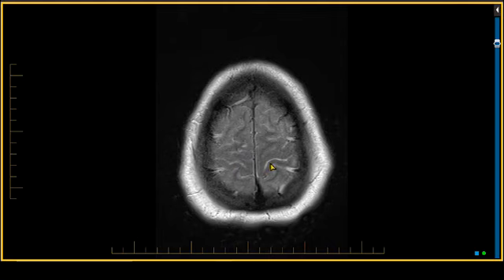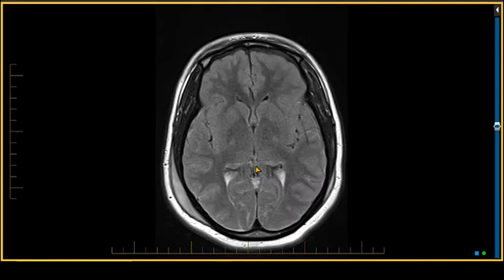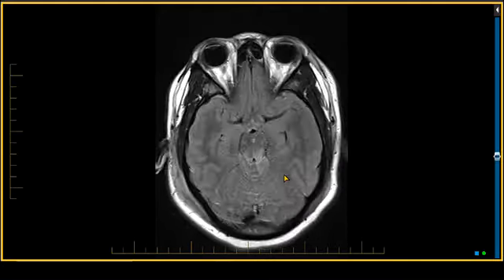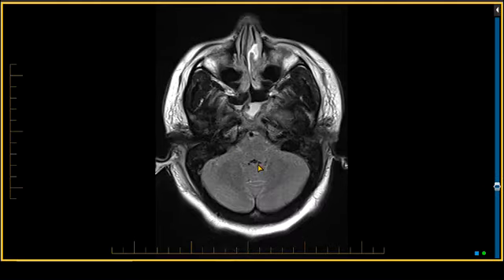Now, this may be any pathology in the subarachnoid space, so it can be meningitis in a different situation. So there's subarachnoid hemorrhage, and we see that indeed there is injury to the splenium of the corpus callosum, and there is blood that is seen within the occipital horns of the lateral ventricles on the examination. The next thing as we go downward we start to see is abnormal signal intensity in the back of the brainstem at the tentorial edge.